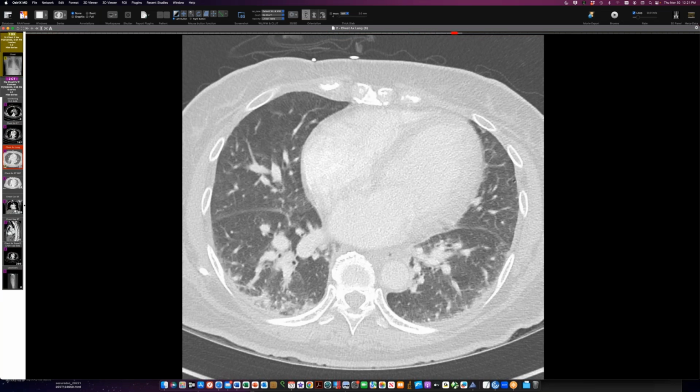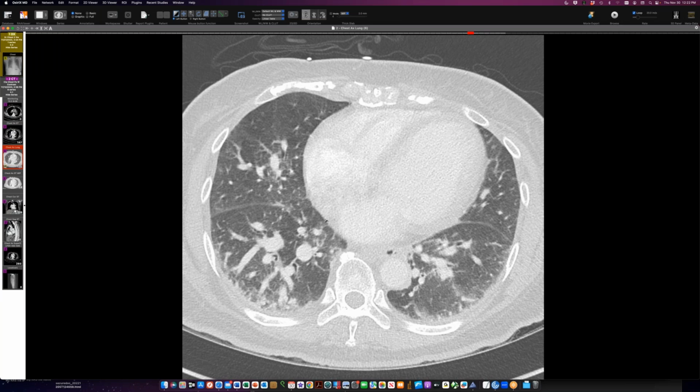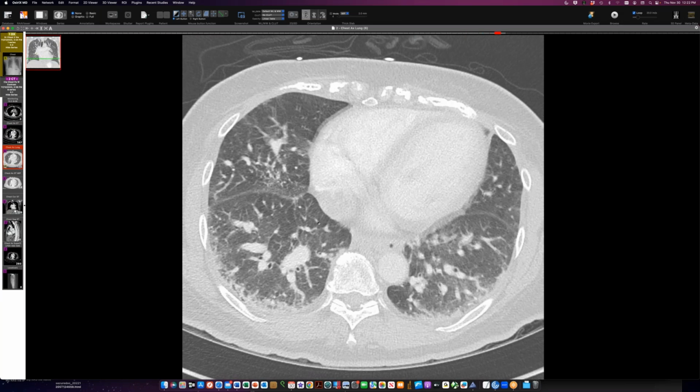Again, we see vessels touching the pleura in non-dependent parts. So back here, it's a little ambiguous, but up here, it's clearly unweighted lung and the vessels really are reaching out to the pleura. And we see the same thing on the other side as well. So this is hepatopulmonary syndrome. The heart's kind of big. They do the workup looking for shunts.